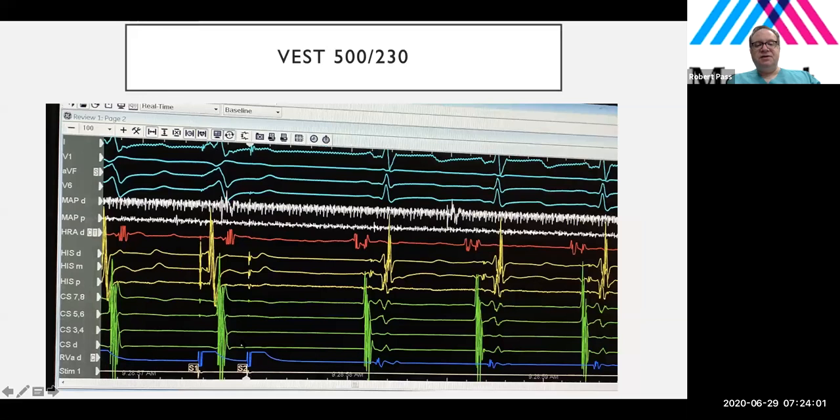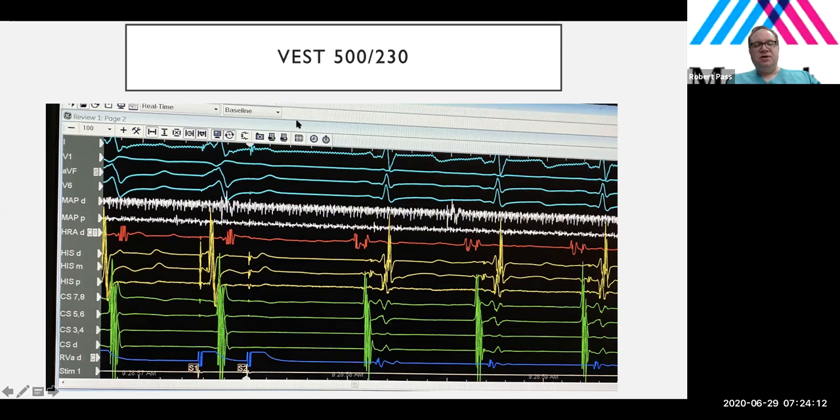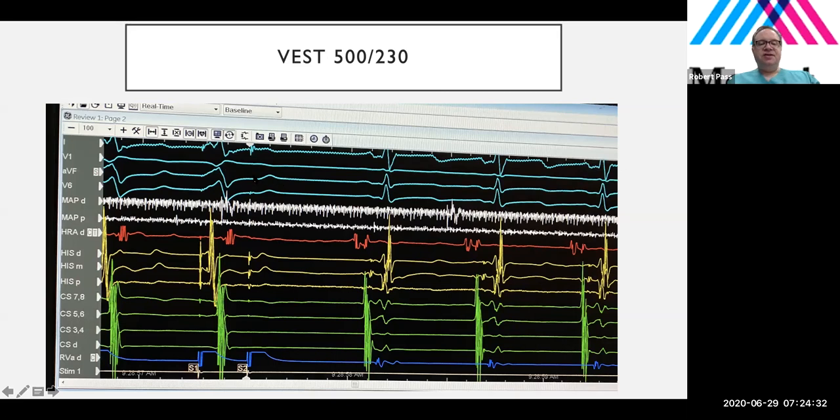And then we pace the V, and Perna, what happens here? So this is 500, 230, pacing the V, S2, and what would we call this, or what is this? So when you pace it at 230, there is no conduction here. Like I see the P wave, but then there is no conduction of that P wave. Well, not exactly. This is actually a T wave from the prior QRS. You're right, it looks like we're paced, but remember, this is ventricular pacing, not atrial pacing, okay?